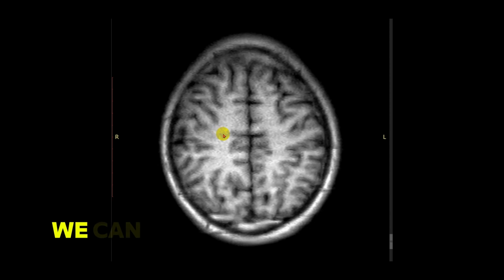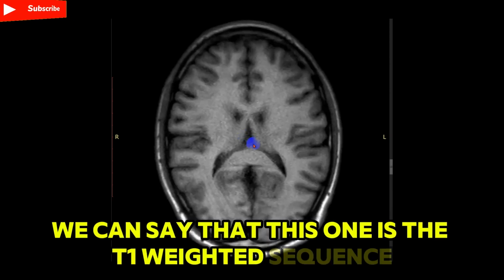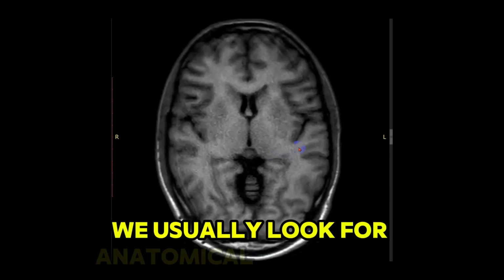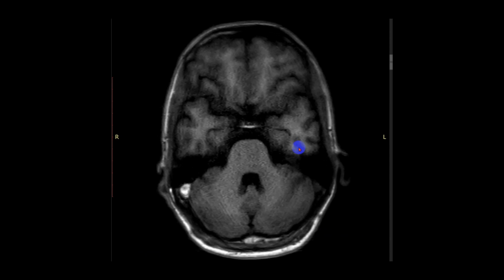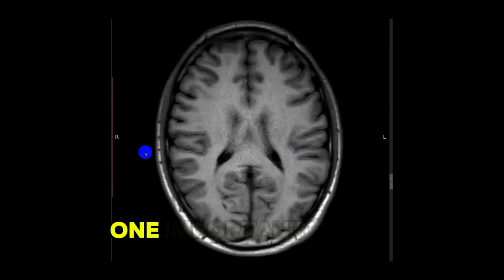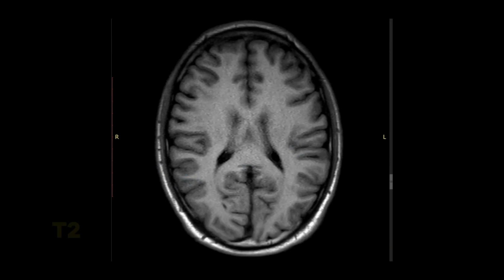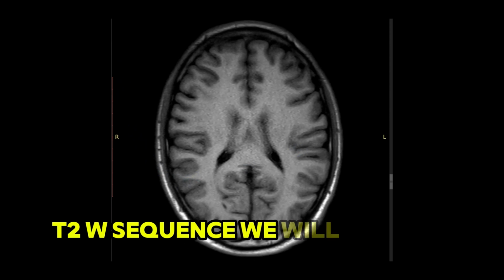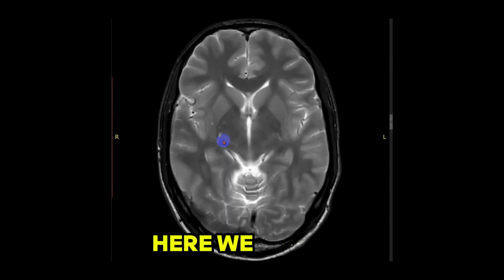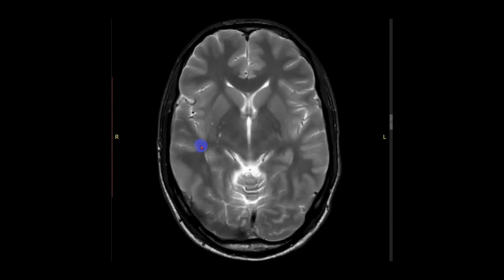So we can say that this one is the T1-weighted sequence, and in this sequence we usually look for anatomical structures. And then one other important sequence is called the T2-weighted sequence. We will see the T2-weighted sequence now. Here we can see this is the T2-weighted sequence.